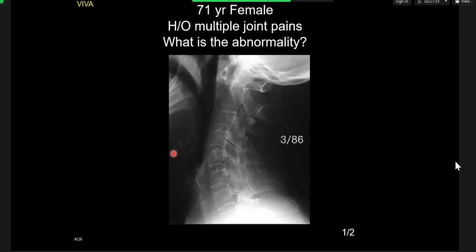My conclusion: the cause of this increased distance at this joint may be ligamentous affection at this region, and this is one of the important findings of rheumatoid arthritis. Okay, well done. So what is the normal distance, by the way, in an adult? I think the maximum is 4 or 5 millimeters. So in an adult 3 and in a child 5. So remember, in a child more leverage is allowed. You have to remember this.